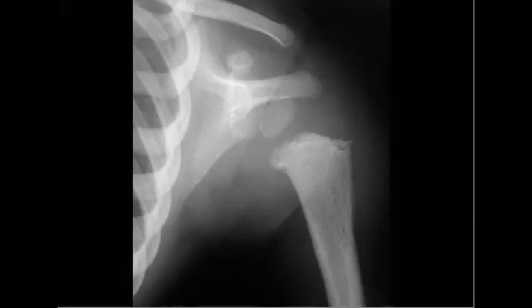What will you need to do if you find this in a patient? Full body survey. Yeah, skeletal survey, including brain CT. Perfect. And also you will discuss with the clinician. So what highly specific fracture do you expect to see? The metaphyseal one, right? Either in the humerus, like this one, or in the femur, or in the tibia.